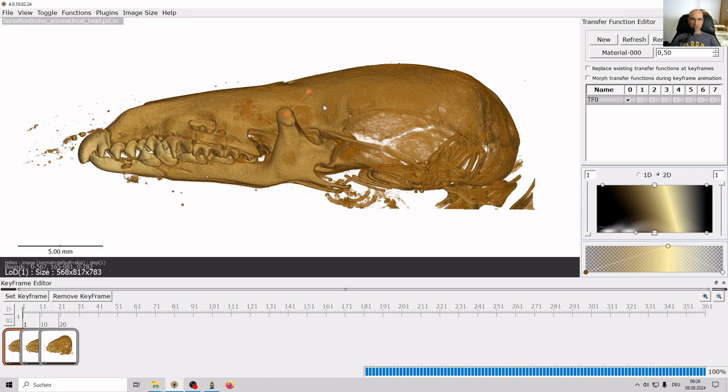That's my path. Now, you don't necessarily want your label, which is going to appear next to that first point that I created. Maybe you want that out into space. So in order to do that, you can't start your path out in empty space. It has to be linking to a rendered voxel, but it's not a big deal. So you just take the original point you suggested, drag it out to wherever you want the label to appear, and there it is. And by the way, that L 2.95, as you might guess, is the length of that path. So that's really useful for other reasons.